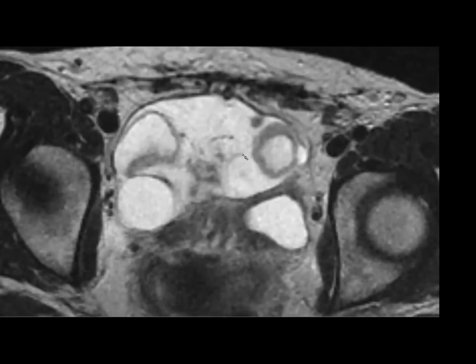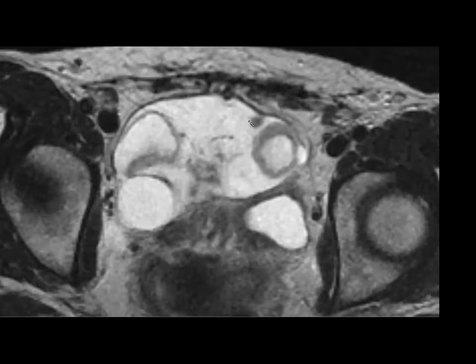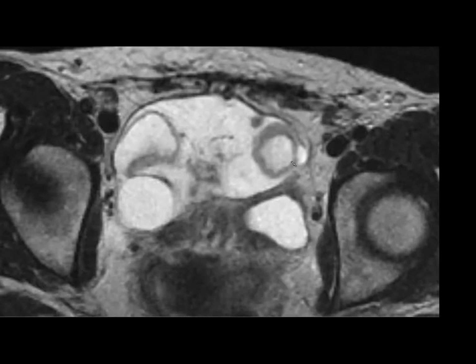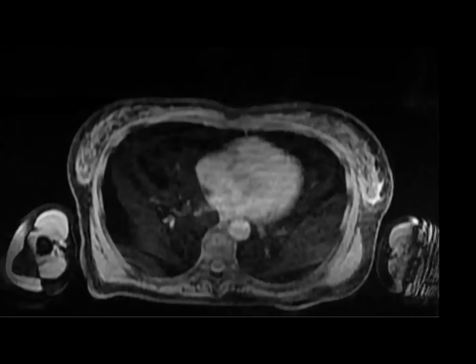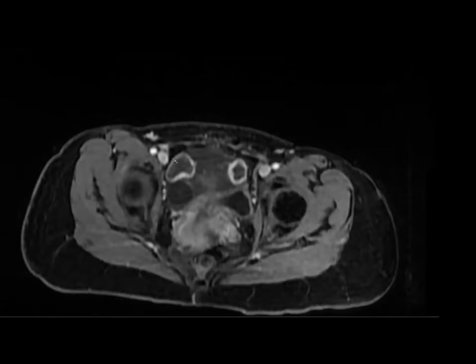They actually treated this conservatively. They never resected it. The patient had all this retroperitoneal fibrosis and stuff. And so her pain resolved. So this was never removed. But I thought this was a good example of this hemorrhagic follicular sign. So you're saying it has mixed signs. So the edema suggests that it's still viable, but this perifollicular. I'm not sure that's a follicle. That might be just the regular corpus luteum. Yeah, it's got some dark, I don't know, it's not really black. Okay, that's a good point. These were all enhancing. You can have multiple corpus luteum?